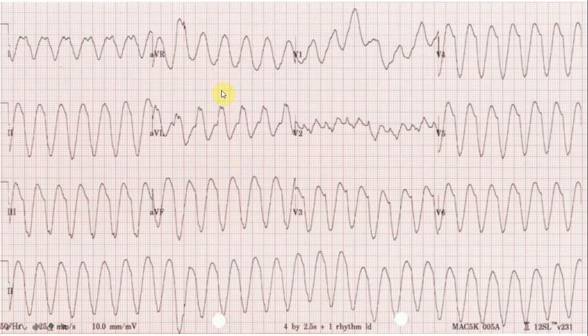If we follow the Brugada criteria, the very first step is absence of RS wave in the precordial leads. This feature is fulfilled in this ECG. Therefore, the ECG is suggestive of ventricular tachycardia. As the first step of the Brugada criteria is fulfilled in this ECG, we do not need to go to next steps. Now, to compile all this information together, I am of the impression that the patient has monomorphic VT.